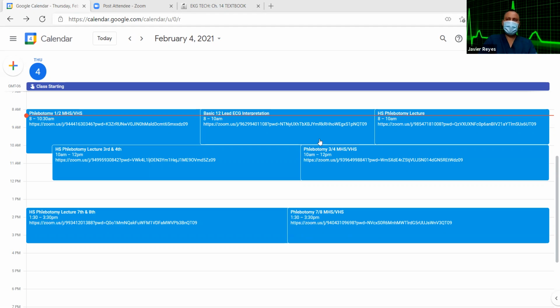So we saw yesterday on figure 13.3, the examples, right? On the chest leads, we saw the deep Q signs. Remember, most leads have positive deflections, except for maybe aVR. So when we looked at V1 or V2 through V6, we noticed that there were significant Q waves, and then we saw the ST elevation in V2 through V6, T wave inversion in V6, and so on. So all the telltale signs of a STEMI. We just call them a STEMI heart attack.